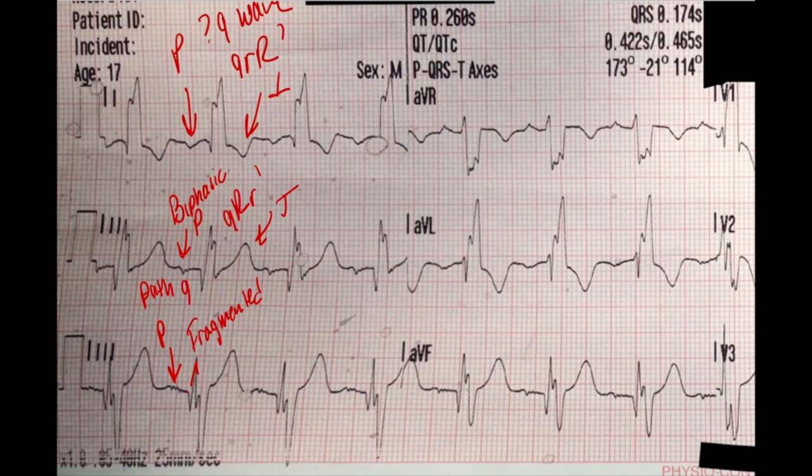And to keep that in mind, when we look at this Q wave, that's definitely greater than 2 millimeters, and if we ask, is it greater than 25% of the height of the QRS complex, that question becomes a little complicated to answer. So the Q wave, we'll say, is there. It's concerning, but it's kind of hard to figure out if it's a true pathological Q wave or just a part of this grander fragmented QRS complex.